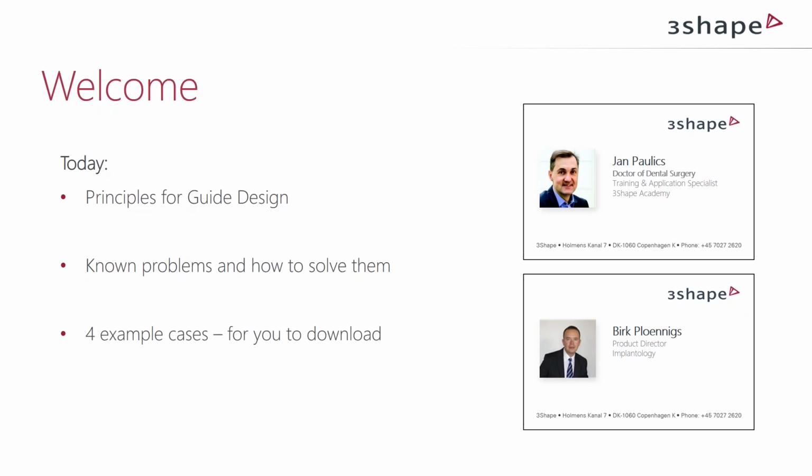And as a first, we will also show you 4 examples, 4 cases. We will do one case live, and then afterwards we will show you a link where you actually can download these cases and try for yourselves and see if you can beat me in the most fantastic guide design. So a small contest perhaps.